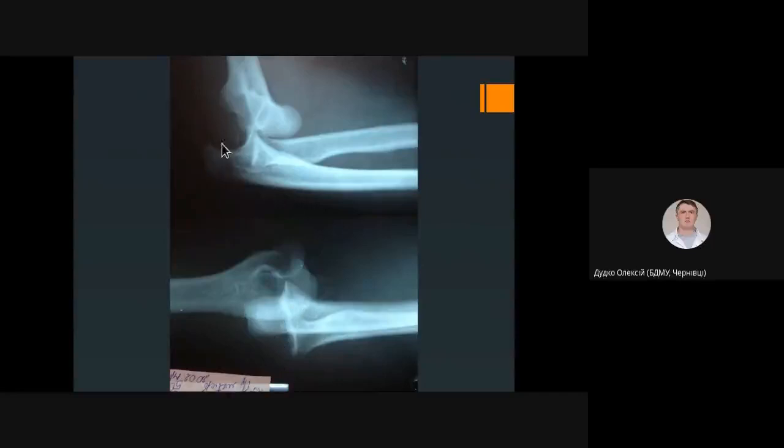On the lateral view, we can note that both bones are located posteriorly from humeral condyle. That means that this is a posterior dislocation. Actually, if we are classifying forearm dislocation, we know that there are four types. Two types are anterior dislocations, and two types are posterior dislocations. Posterior medial and posterior lateral. Actually, the correct diagnosis for this dislocation would be posterior lateral dislocation of the forearm.